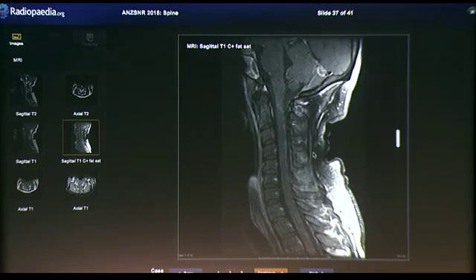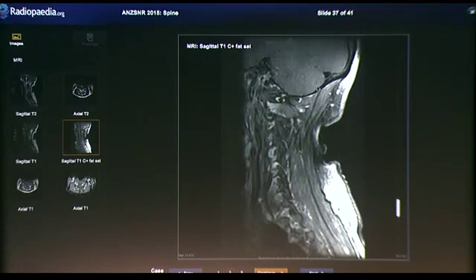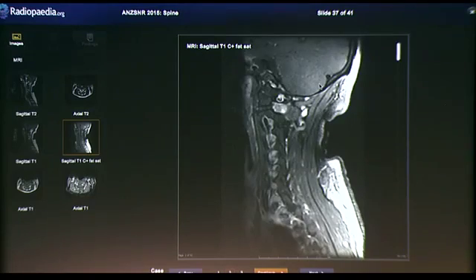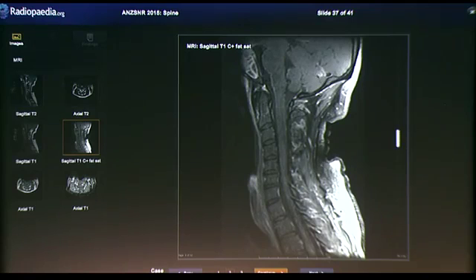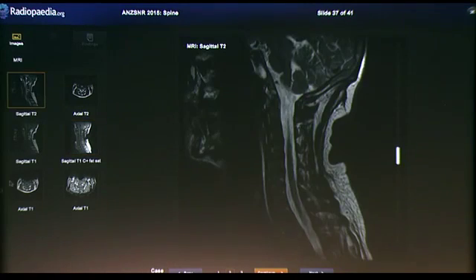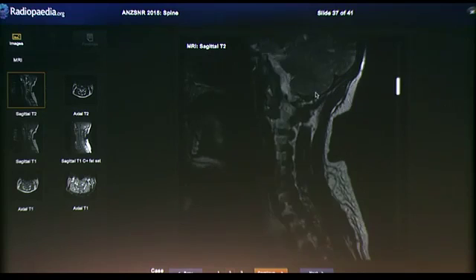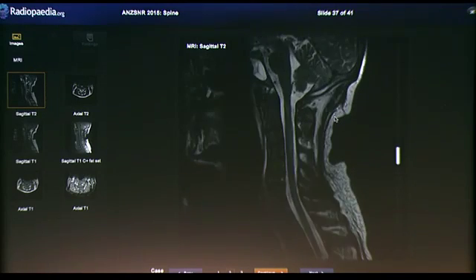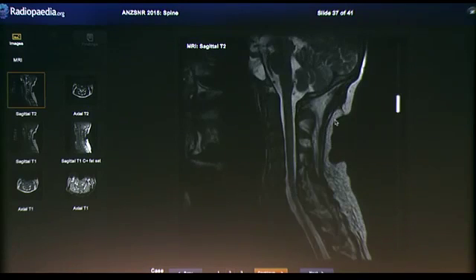Now the other thing that we noticed on the MRI is that there's these funny enhancing spots in the cerebellar hemispheres, bilaterally actually, which in retrospect on the T2, you can actually see that's T2 signal abnormality and a bit of mass effect.